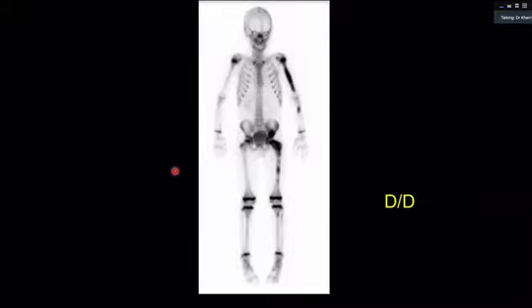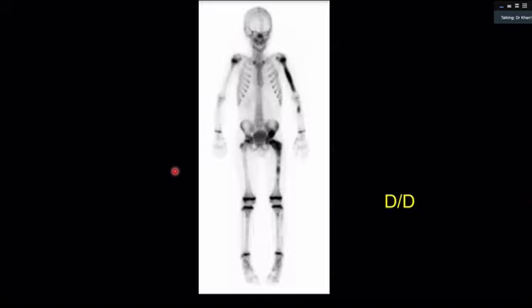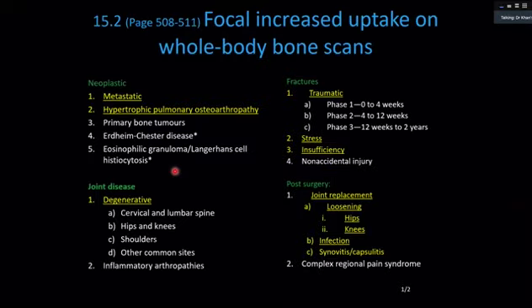This is polyostotic fibrous dysplasia, and polyostotic fibrous dysplasia comes in the exam so often on nuclear medicine. Even PET scan, bone scan, both, SPECT, everything, fibrous. Please keep your minds open. I don't know much about nuclear scan, but I'm just showing you because it does come. We have got a dedicated nuclear medicine A to Z course.